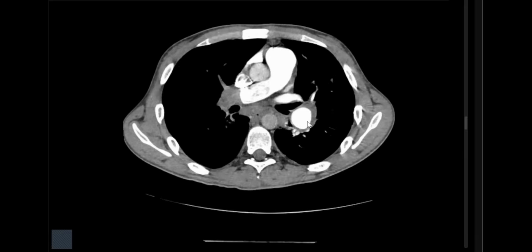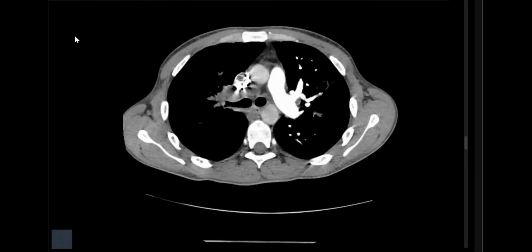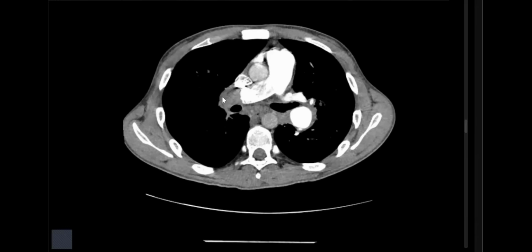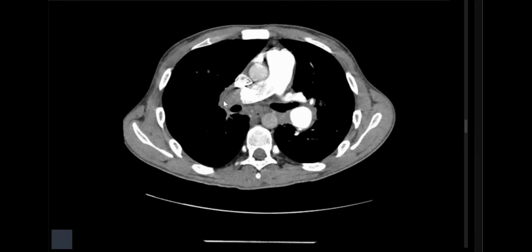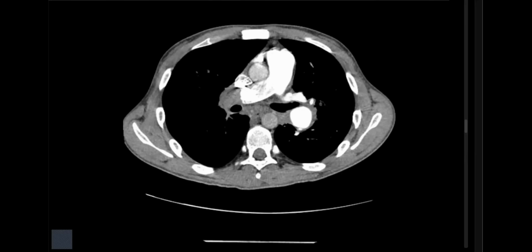Very good. So it was a case of inflammatory or mycotic aneurysm. Another possibility may be pulmonary hypertension, by the way, but not significant in this patient. Septic pulmonary emboli or pulmonary embolism in general is a common exam case and very important. It's a safety point, either present per se or secondary to another condition.